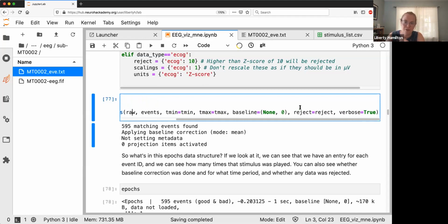And then it also gives you a baseline. So if you would like to baseline your trials, which basically means, would you like to have all pre-trial activity be normalized so that it is around 0? In this case, you can specify just none. If you had none by itself, that's no baselining at all, no baseline correction to any of the trials.